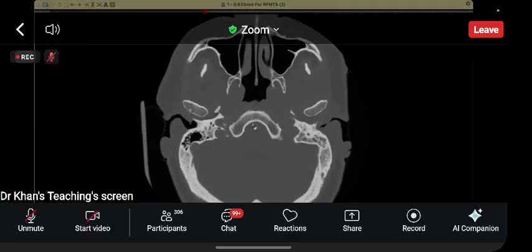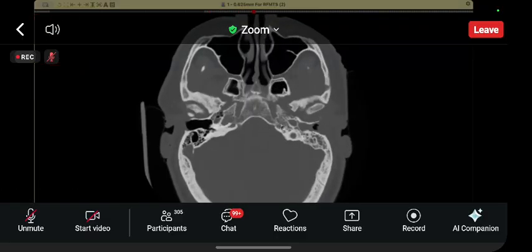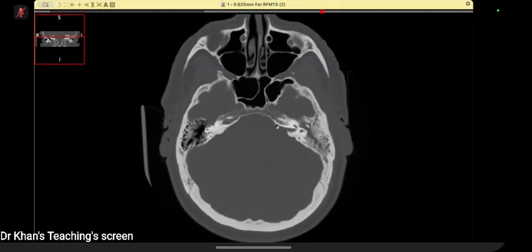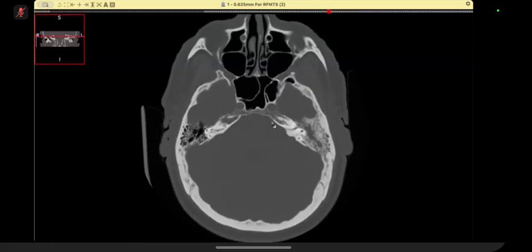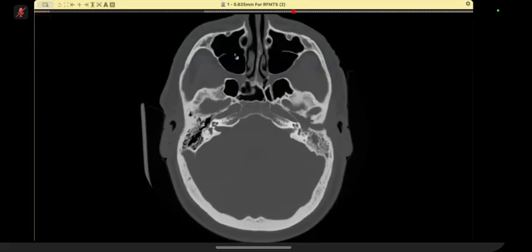So remember that. This is the clivus. And you can see that this is the petrous apex where I am pointing out. So this is the apex, and the nerve is passing here through this, the cavernous portion. So this is passing through the sphenoid bone. Well done, candidate.